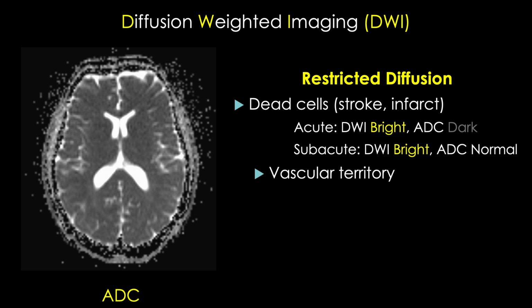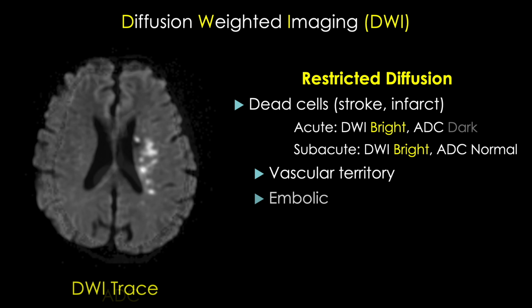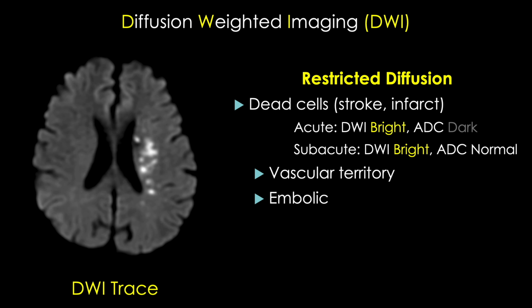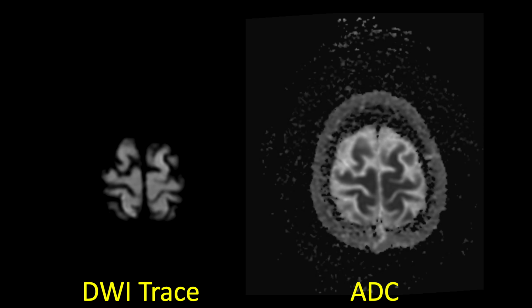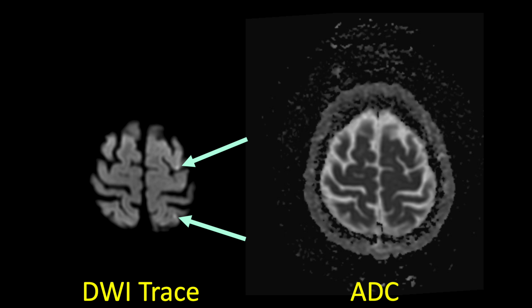Another form of stroke is what we describe as an embolic pattern. Technically, the first example was embolic, but when this term is used, it usually refers to when multiple smaller clots travel through the circulation into the distal arteries and into perforating vessels, causing more focal smaller infarcts. In this example, we can see tiny punctate cortical infarcts involving the left frontal and parietal lobes.